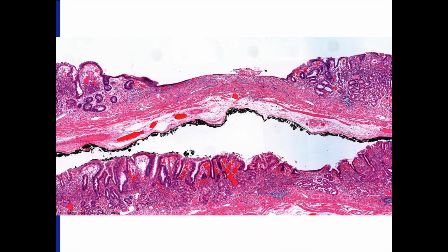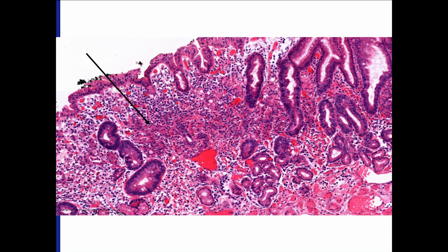The upper cut shows a relatively depressed lesion, type IIc area, and the lower cut is a relatively normal looking part, type IIb area. In the relatively normal looking area, you can see a lot of isolated single cells spread between the normal gastric pits.